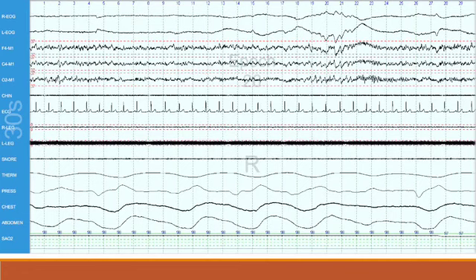And here is definite R in a montage that includes your respiratory. So you can kind of see here, you see slow rolling eye movements are here, but you also see the rapid eye movements here, okay, and the slow rolling here. That's all fine, all right. And then you also see your sawtooth waves, kind of a serrated look right there as well, okay.